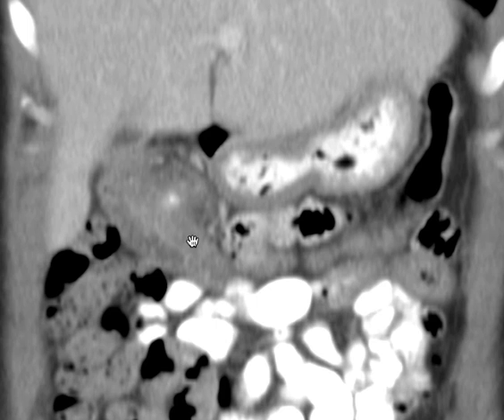Okay, so the findings. The description that I would make is there is thickening of the bowel wall involving X centimeters of the proximal transverse colon. Let's see, what are we getting? We're getting about 7 or 8 centimeters there. So there's mucosal thickening of low attenuation consistent with edema.